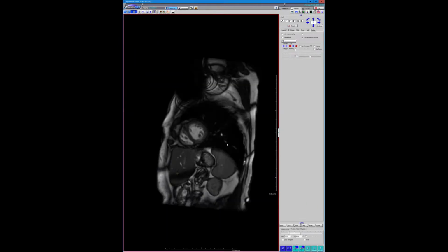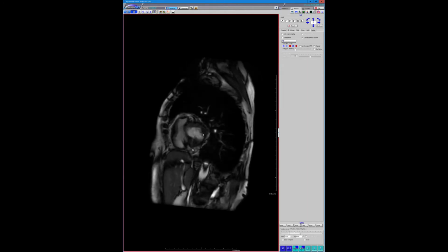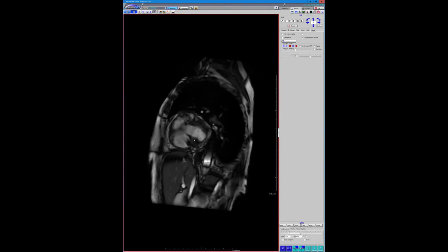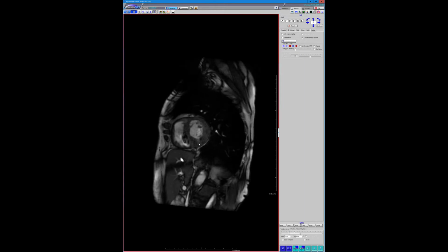The patient supposedly had a history of a coronary embolism that led to significant abnormality, and that area is kind of down, especially as you get towards the mitral annulus, it's not moving. But the myocardium around it actually doesn't look that horrible.